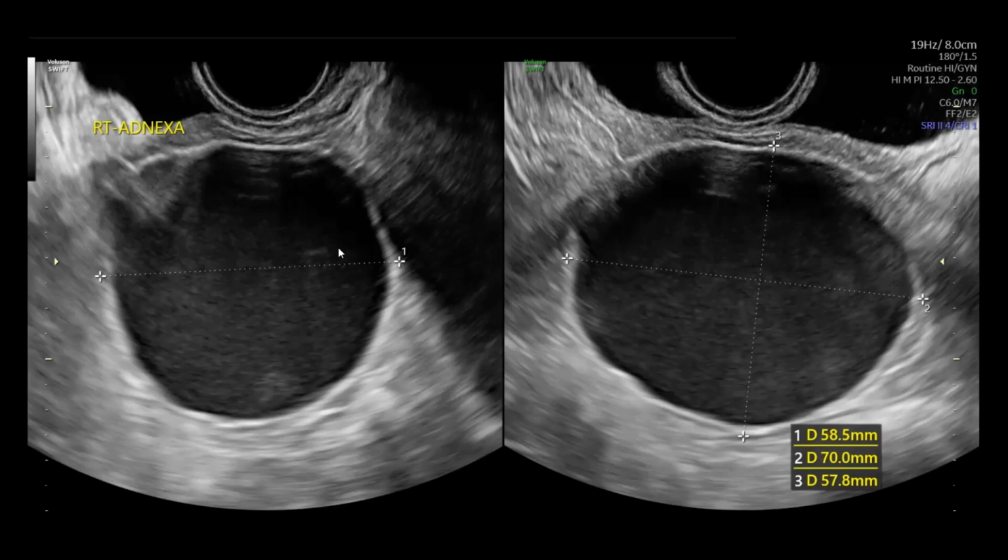And we're not seeing in this picture or this picture any normal ovarian tissue around it. So most likely, based on what we've already seen, this is going to be an adnexal lesion, not ovarian. It'll be a tubal origin lesion. I call these paratubal cysts because they come off of the fallopian tube. They don't come off of the ovary, even though a lot of people use the word para-ovarian. They're, of course, next to the ovary. But I find paratubal to be a little bit more true to the origin in that they are coming off of the tube. And so it's unilocular in this picture.